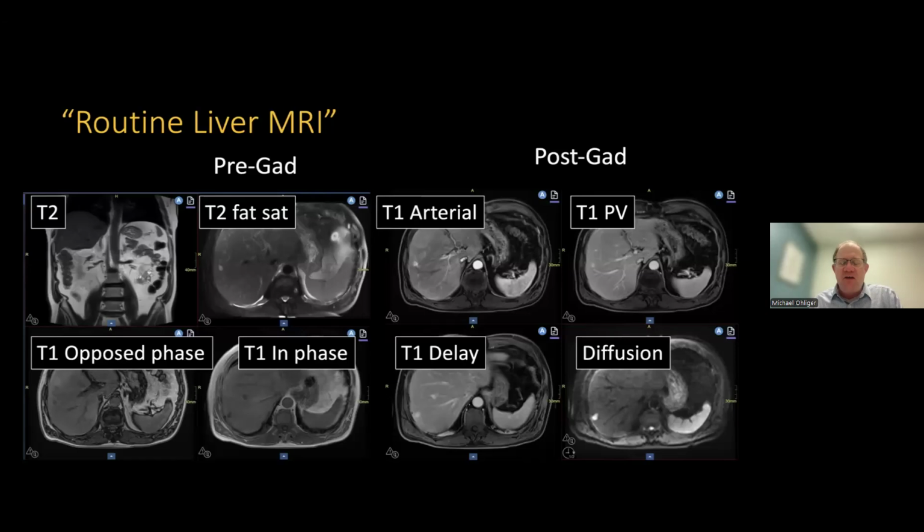And the difference between a pancreas protocol CT and a regular CT is that you have an extra phase of imaging, and that extra phase tends to look at the blood vessels a little bit better. It also, when you have a tumor, can sometimes give you better contrast between the tumor and the pancreas itself. The blood vessels are important because that's part of pancreas cancer staging. You want to see the relationship to the blood vessels. And the other reason it's important is that if you think there is a tumor, then you can see it.